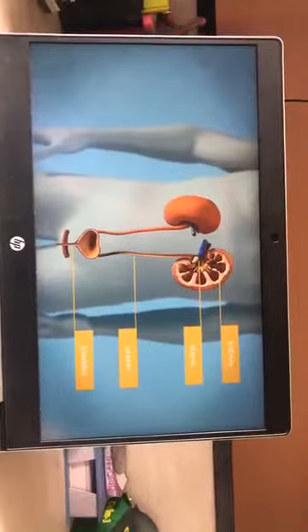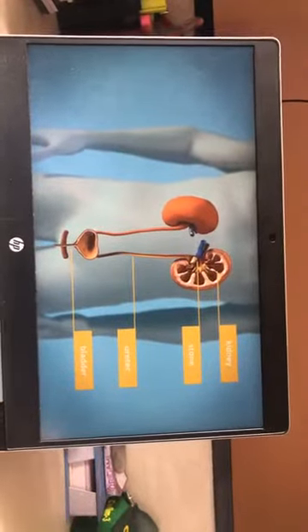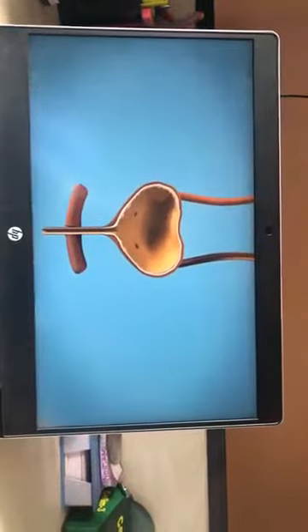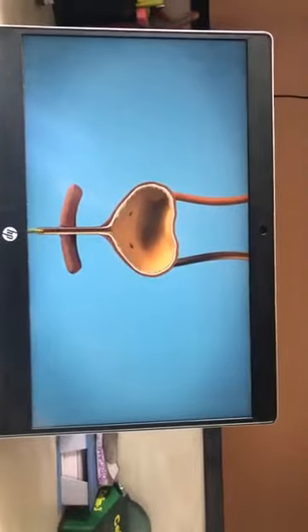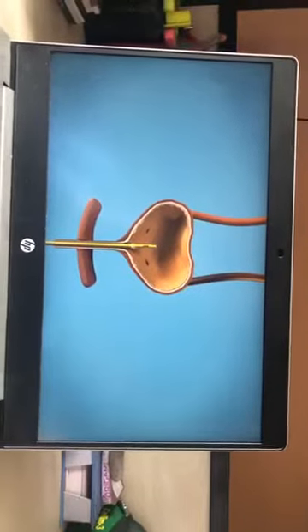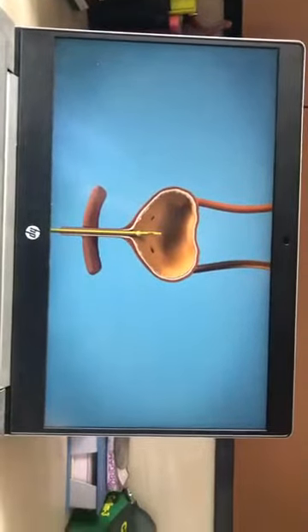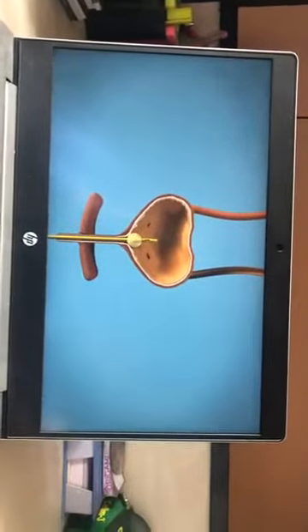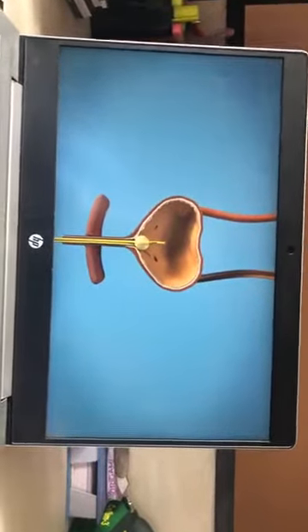This animation shows the access is made from behind, because from behind the kidney is directly attached to the posterior wall. So there is no chance of injury to the other structures if you do the PCNL with proper X-ray guidance or ultrasound guidance.